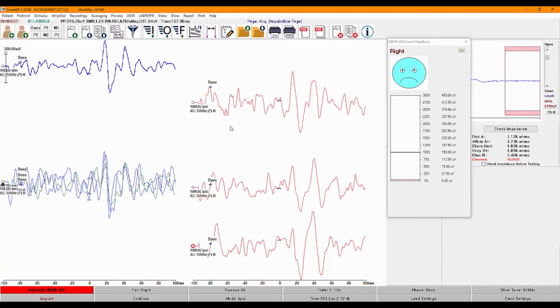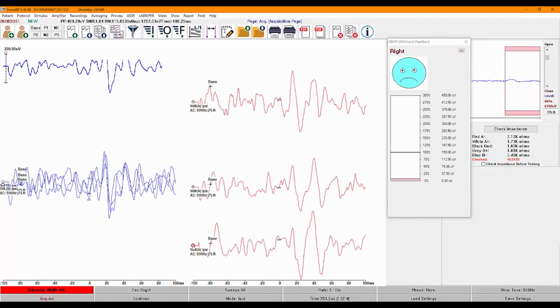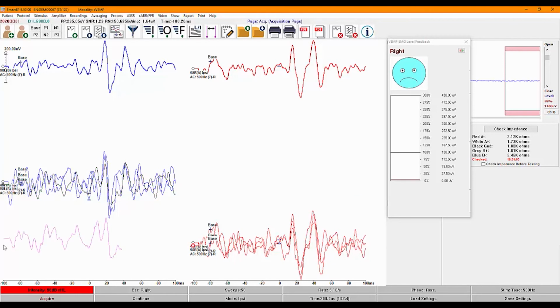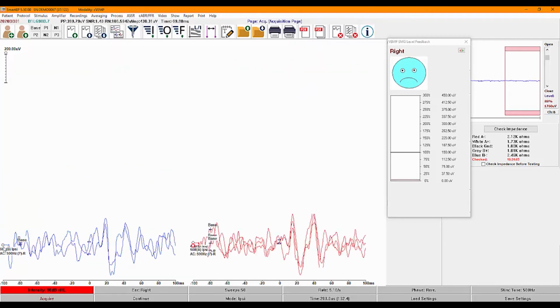Now select the 3 raw recordings for each ear. Click and drag each one and arrange and overlap them on the bottom of the screen. Your grand average VEMP recording will appear in bold at the top of the screen. Label your recordings P1, N1, and make sure to drag the amplitude marker of P1 to the N1 location.